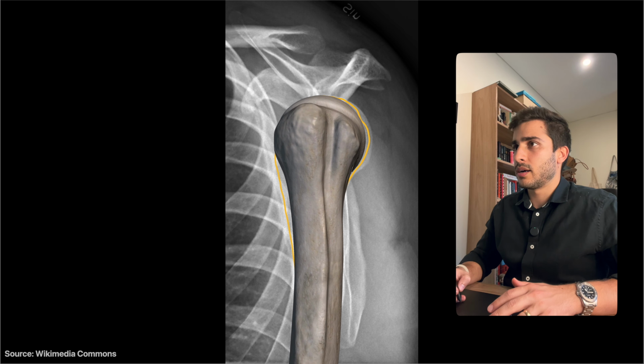But the reason it's called Y is when you sufficiently rotate it, I'm just going to hide this particular one here, you see that the scapula has a Y appearance. And that's why on the x-ray, it looks like this, essentially carbon copy of this. Scapula there, humeral head in the background, overlapping the scapula for the lateral view. And that's kind of what you see over here. Again, the edge of the scapula, if I was to trace it, would be something like that. Okay, cool.